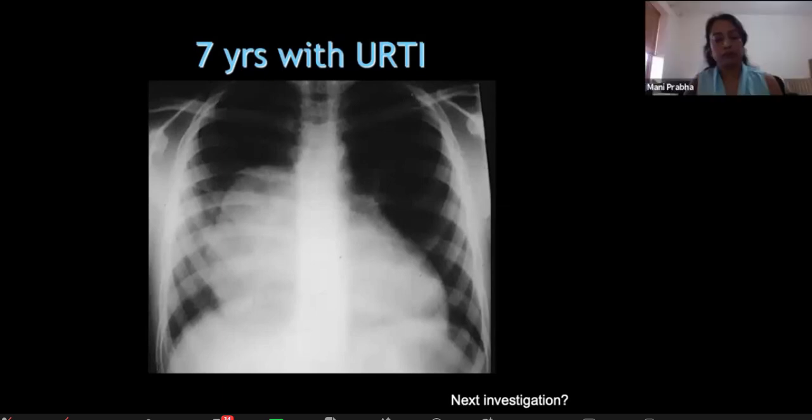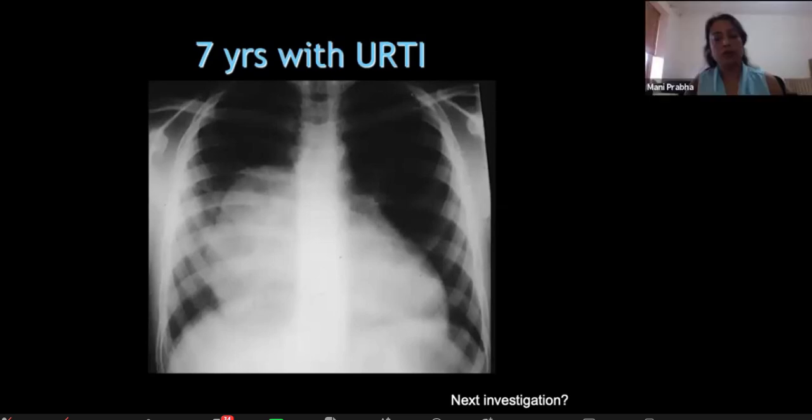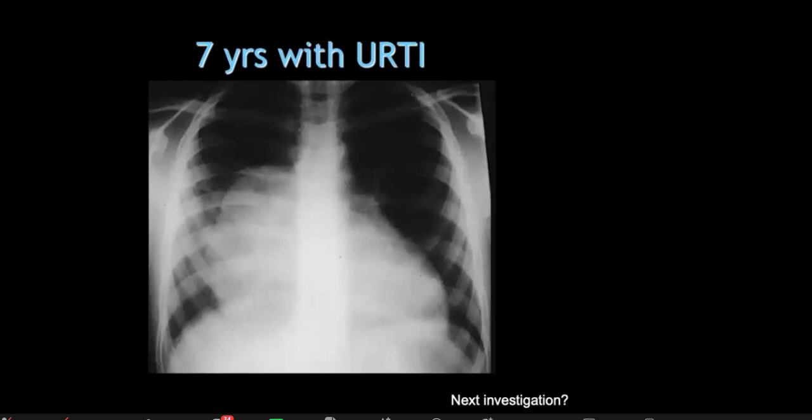There's no lung volume loss, and the rest of the lung, I think it's overexposed on both sides. So appearances are quite suggestive of a mediastinal mass. The location is quite typical for a cardiophrenic... What do you call it? The cyst, bronchogenic cyst.